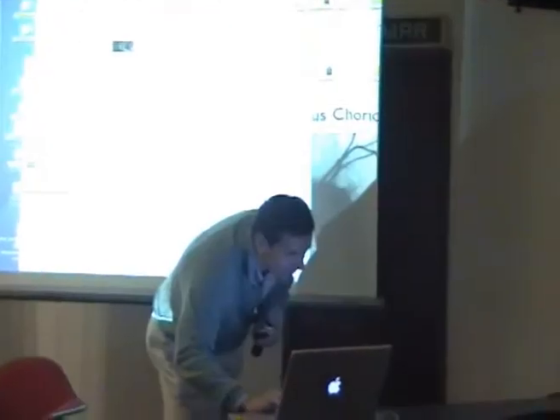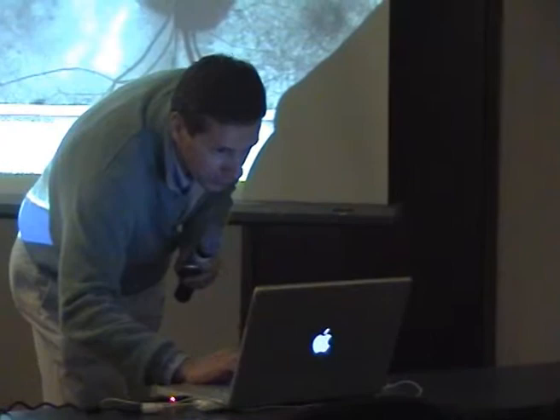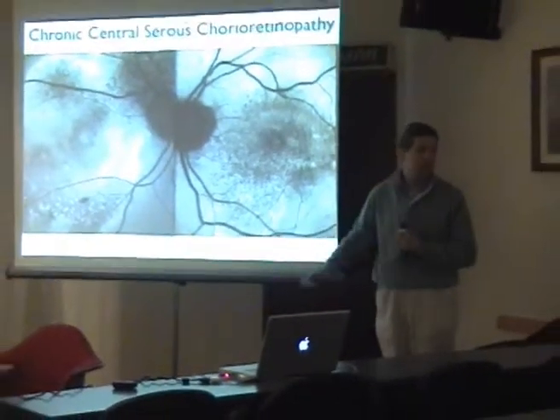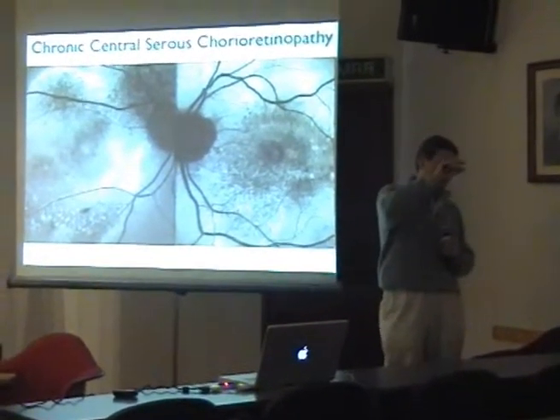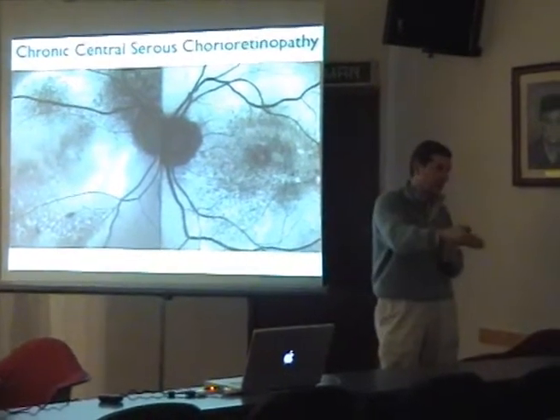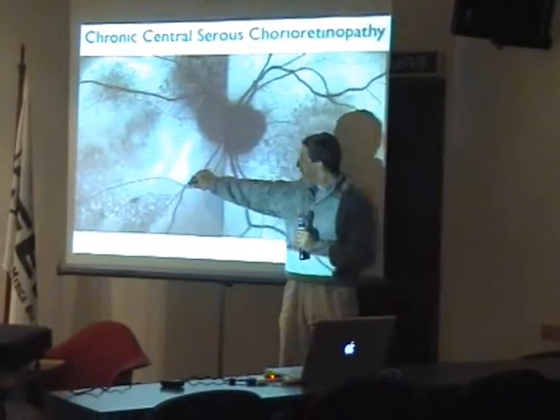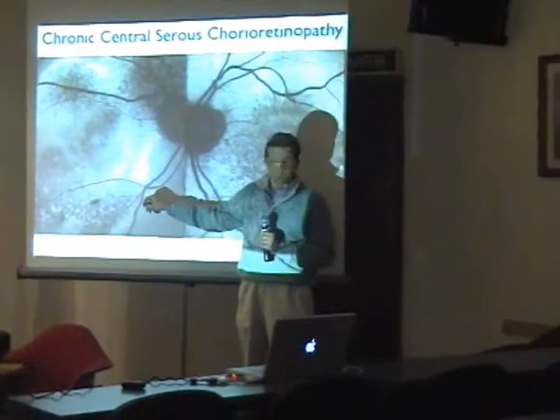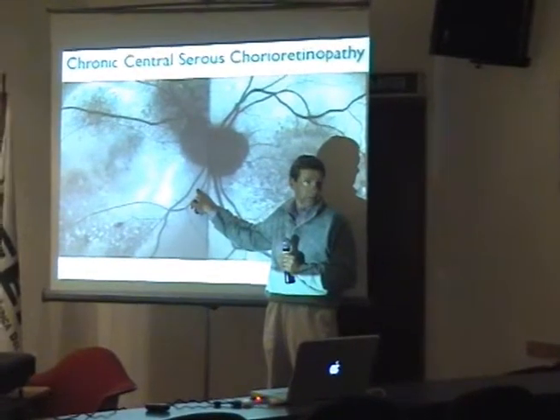And this was just an information. So why is the fluorescence increasing here? Because there is no photoreceptor. There are no photoreceptors, and so there is no photoreceptor pigment. You see behind. In fact, if you bleach the rest of the photopigment, this part stays stable and this increases.